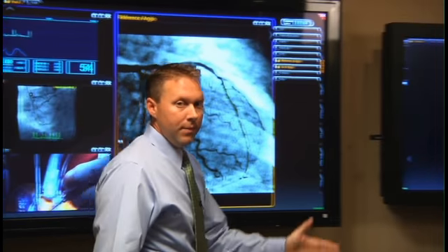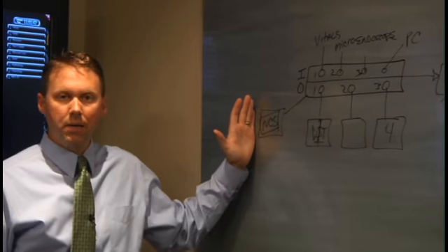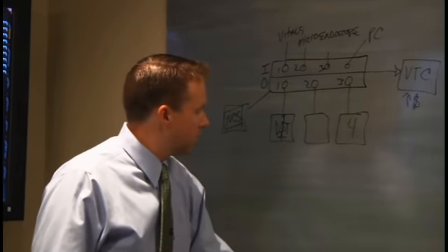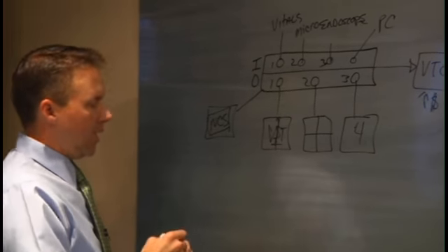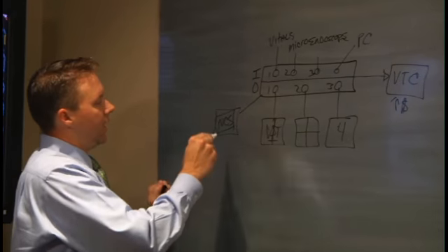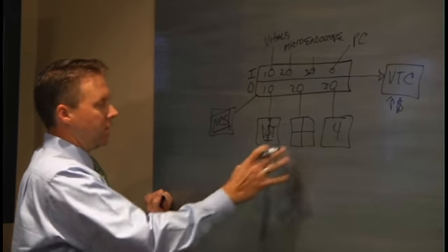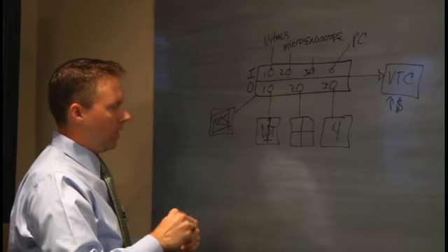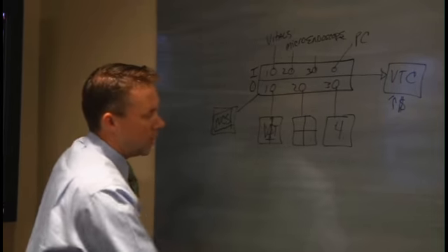If you remember, at the nurse command station over here, this is where my templates would be set up. So if I wanted this particular monitor to have a split screen, they've got some software packages in here that allow this functionality on top of this video switch, and the nurse can actually page through a series of templates until they find the one that they want, and then they have to assign the content accordingly. So it's a very manual process to get something laid out the way that I want it.